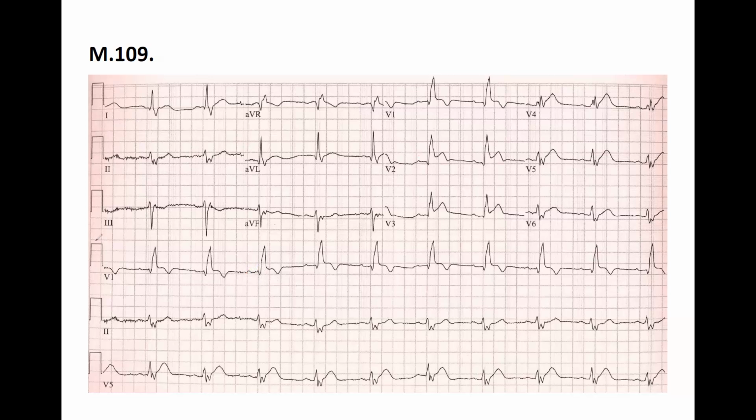Next, the QRS complex, is it wide or not? It's not okay. That's wide, very wide. See here, for example, coming here and ending here. Now, if you have a wide QRS, what is your thought? If it's wide, then it's some kind of intraventricular block.